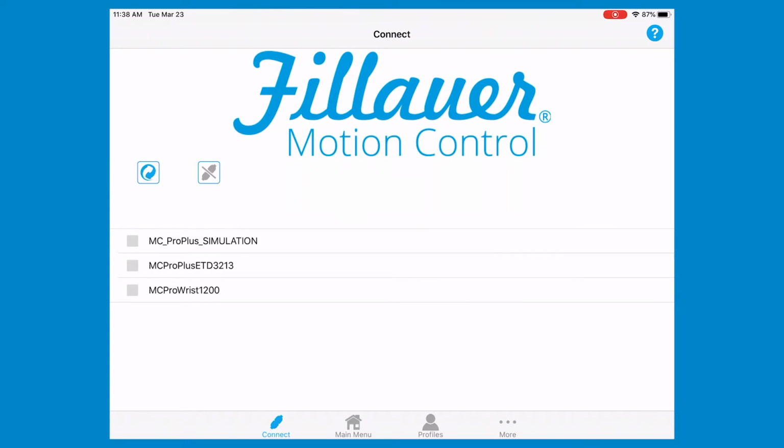As they are discovered, they will appear below the simulation program. To choose a device, simply tap on it. If a device does not show up on the screen, make sure the device has a fully charged battery and is turned on. Tap the motion control ETD.